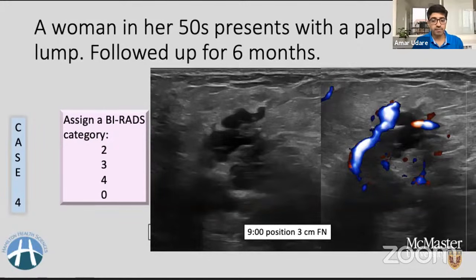we avoid that pitfall. So she was recommended a follow-up of 6 months. So it was quite certain that some of these lesions appear to have what looks like some dilated cystic spaces. One of the most common entities which has this appearance is nothing but fibrocystic change. Fibrocystic change is an abnormality which occurs at the level of the TDLU.